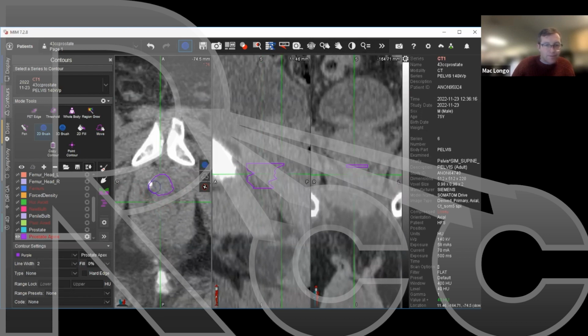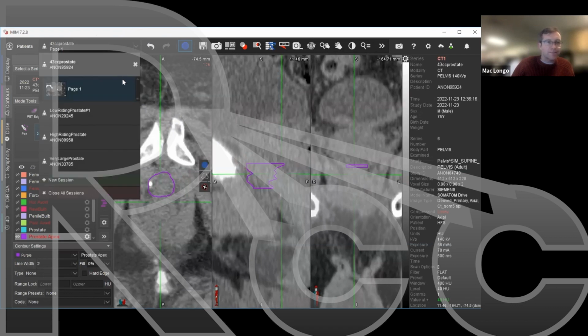Okay, so I'm pointing out some mistakes, and I'm drawing the mistakes, but what are some clues to actually contour appropriately? The other thing is we can use bony anatomy as a landmark, but sometimes that can get us into trouble. And I just want to show you some examples of that.